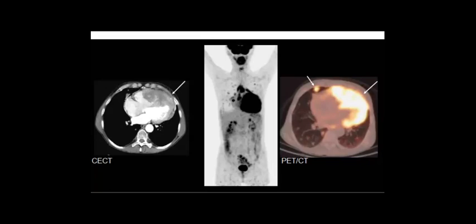Then if it is secondary, and there are also pulmonary nodules here, right? So it can be one of the secondaries, which is very rare, but it could be. Then for the primary, you will search for the primary. It could be this one, which is primary, or this one, and this one could be metastasis as well. Then it will be hard for you to find the primary.